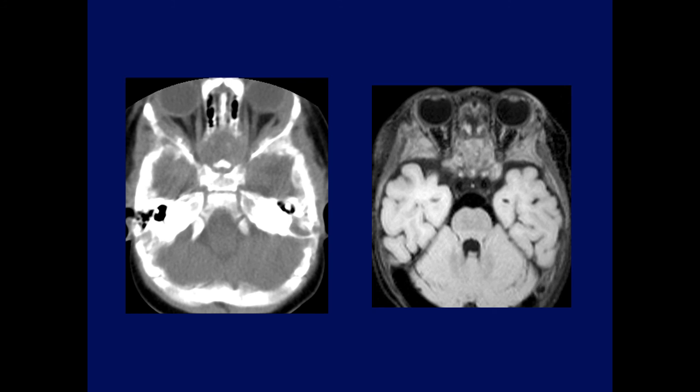Asif hit the nail on the head. Here it is on MR. Marked expansion of the greater wing of the sphenoid. This is a baby. This was a metastatic neuroblastoma. Look at the marked expansion of the greater wing of the sphenoid.